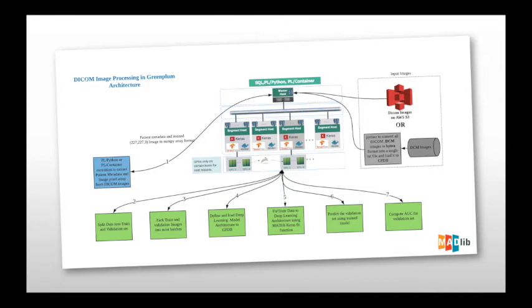So we have to extract the patient's metadata and image pixel data from the DICOM images, then load it into another table where you have all the patient's metadata as well as the image data in NumPy array format. So that part is the first step that we do. Once we do that, we have the image data available in a NumPy array format.